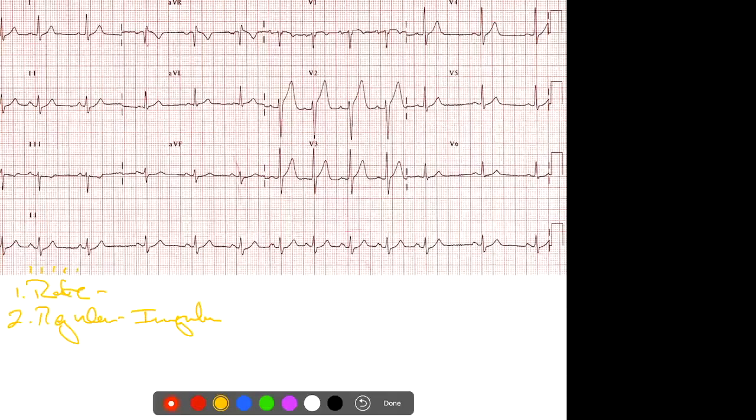1, 2, 3, 4, 5, 6, 7, 8, 9, 10, 11, 12, 13, 14, 15, 16, 17, 18, 19, 20, 21, 22, 23, 24, 25, 26, 27, 28, 29, 30. So 1, 2, 3, 4, 5, 6, 7, 8. So we have a rate of approximately 80. We have a pretty normal rate, not too fast, not too slow, kind of in the wheelhouse here. So we got a rate around 80, and we have an irregular rhythm.